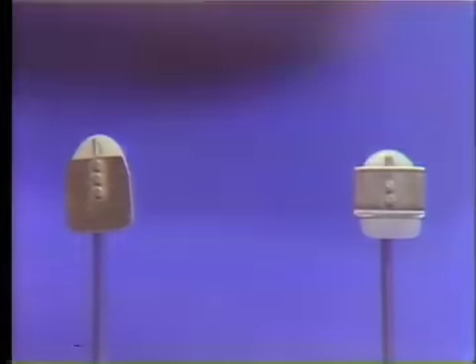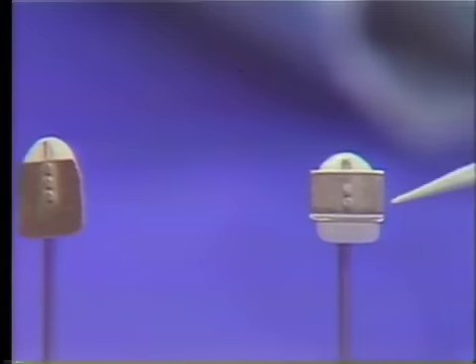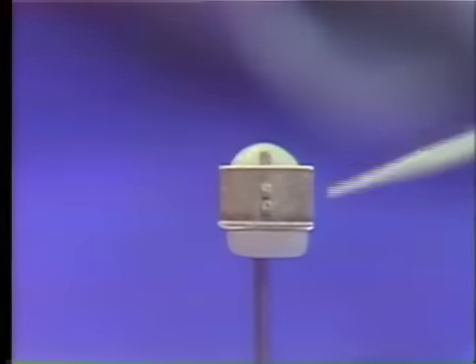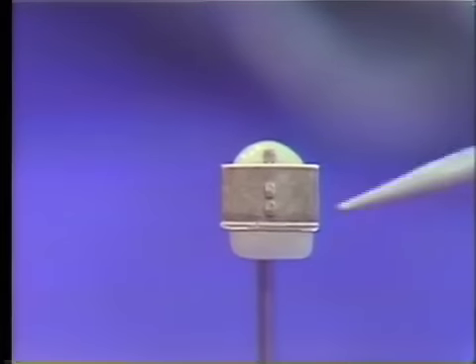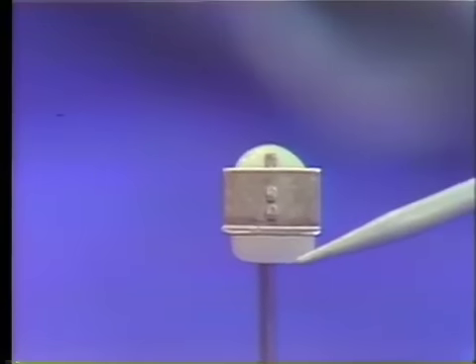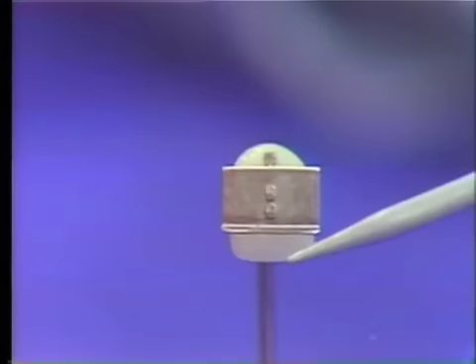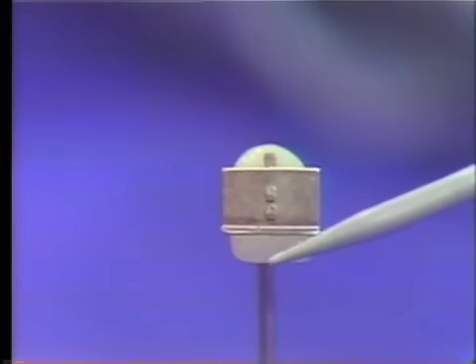And I think you can see in this porcelain biting edge situation here how the backing, as it comes down, turns at a right angle towards the lingual and projects out like that, so that it gives a sort of girder support to the porcelain incisal edge down here. And there is no backing on that incisal edge there, so that it can be extremely translucent when required.